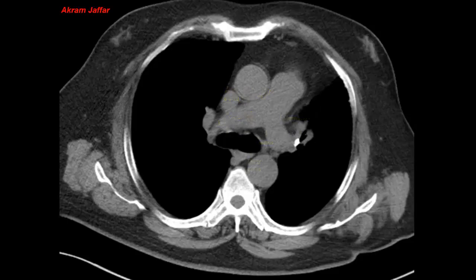Now this is a CT section, almost at the level of the previous section. Here again we can see how the trachea is bifurcating here. It is no more one circle, it is like two circles here. They are trying to get away from each other. This is the superior vena cava and the ascending aorta, and then this is the descending aorta, and we can see the pulmonary trunk dividing into left pulmonary artery and a right pulmonary artery. Behind the trachea is the esophagus.